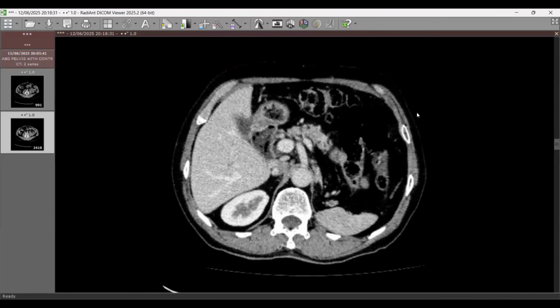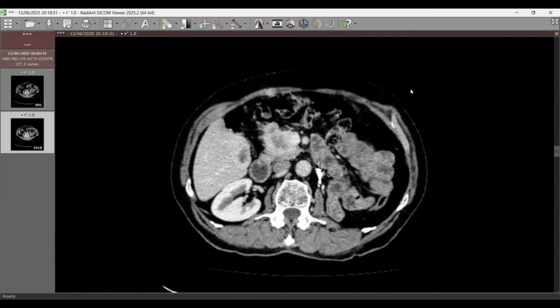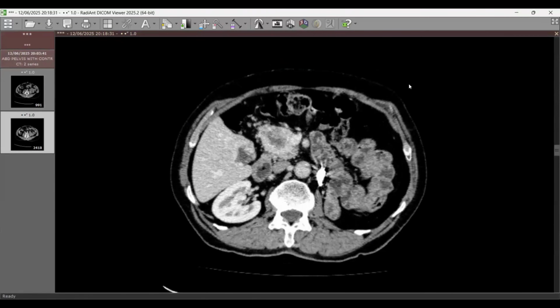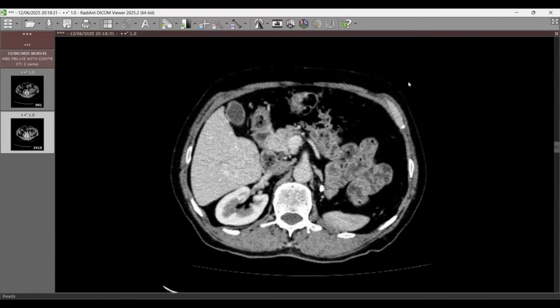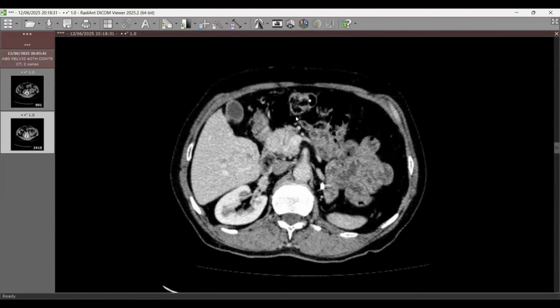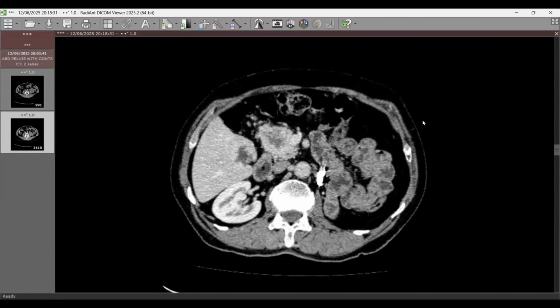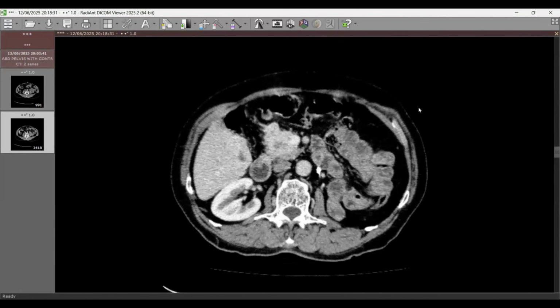Yes sir, that can also be one of the metastatic lesions. But you're talking about hemangiomas, aren't you? Do hemangiomas metastasize? Sir, the other differential is that it can be an arterially enhancing metastasis. Second, it can be a primary with mets in the liver, which are arterially enhancing, so it can be a neuroendocrine tumor. Okay. Your next step would be to inform the gastroenterology team; as these are hemangiomas, you would want to keep them on follow-up.